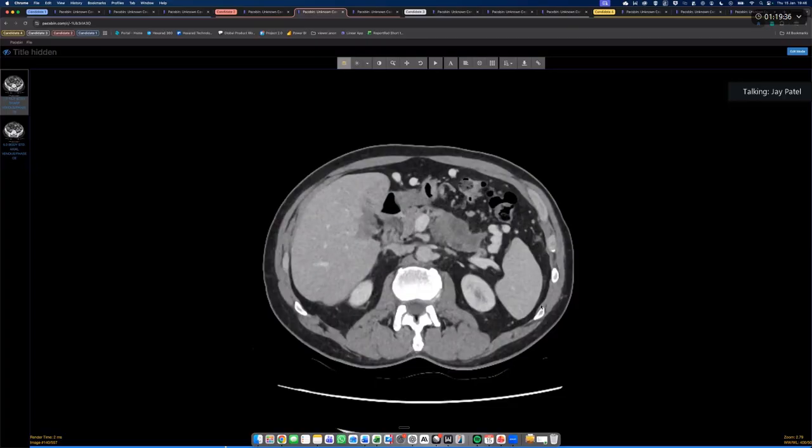An MDT would find that scan an obvious pancreatic cancer, but they can't make any decision as a result of it until they have the cancer staging scan. So always say, I need further imaging and MDT discussion. You may also say something like a CA19-9 for pancreatic cancer.